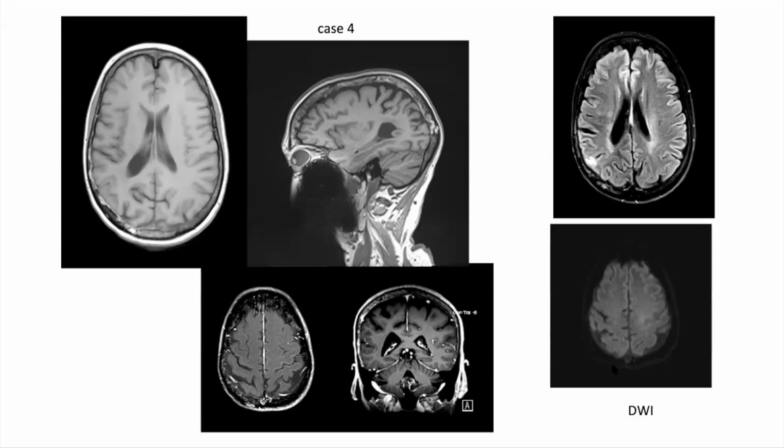Metastatic disease, usually, if you look for it, you'll see some abnormality in the bone, in the diploic space on diffusion weighted imaging, presumably from the dense cell packing in the malignancy in the bone. So these 2 reasons why we would vote against metastatic disease are the preservation of the marrow largely in that region and the absence of any findings on the diffusion weighted scan.